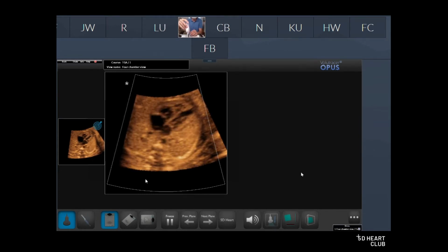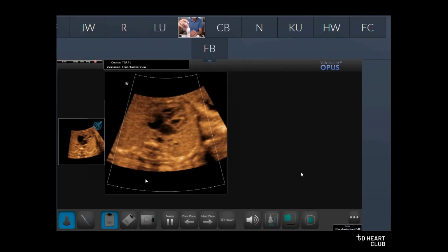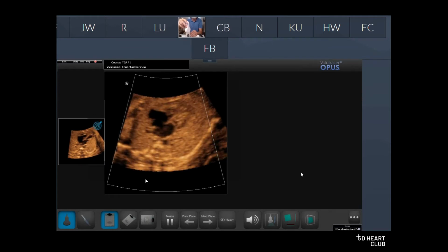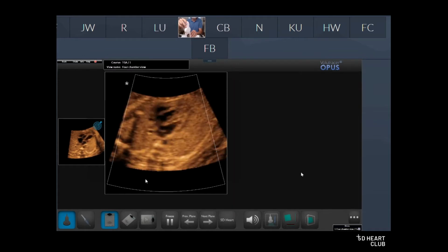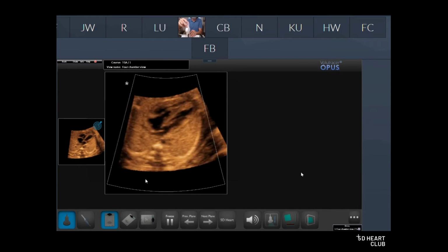So I will rotate it. So this is increasing, decreasing, increasing, decreasing. So you simply stop in the middle. So this is one way, this is the other way, and you stop in the middle. So this is the middle. So now I know that the sides are okay.